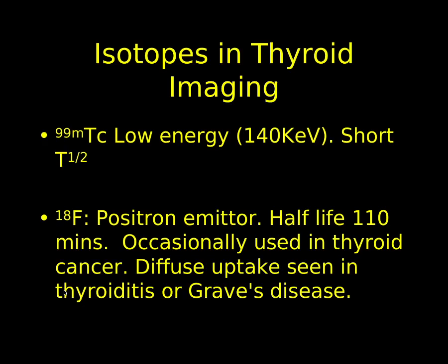If you see a focal area of moderate or intense uptake, a noticeable area of focal uptake within the thyroid gland incidentally on an FDG PET scan, then we certainly might want to think that there's a thyroid cancer there. It might turn out to be a hyperplastic nodule or adenoma, but as just a rough rule of thumb, 1 in 3 of those turn out to be cancers.